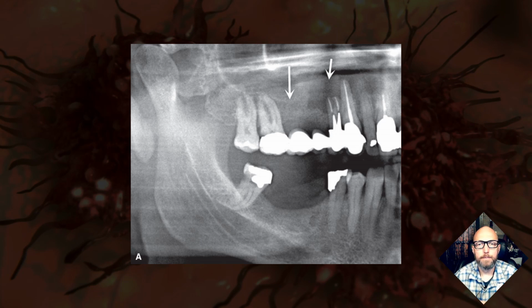All right, how about this one? You see the borders destroyed, the sinus borders. It's nice and strong here, well defined. It starts to get a bit attenuated, very sparse here. And the bone as well. This is not normal bone. Here it looks well defined, but it's not a smooth border, it's ragged. And if you look at this bone here, it is extending all the way back here. So I can't look at this and immediately say exactly what type of lesion it is. This could be a squamous cell carcinoma from the sinus, but this is a lymphoma.